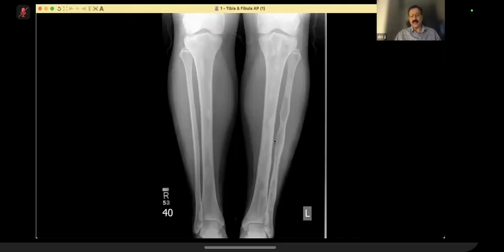But if you look carefully, you see what is happening. The medullary cavity is all obliterated. There is no expansion per se. There is no coarse trabeculae. That's Paget. So what happened? In your mind, you made a diagnosis, and then your mind was trying to pick up the findings of that diagnosis. And this happens. So actually, this is not a Paget's.